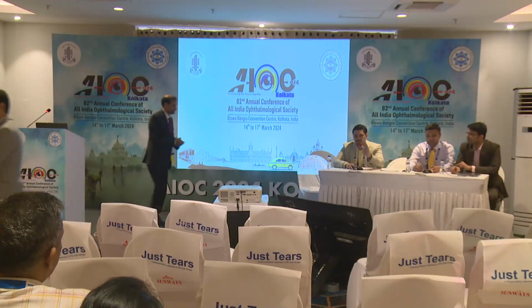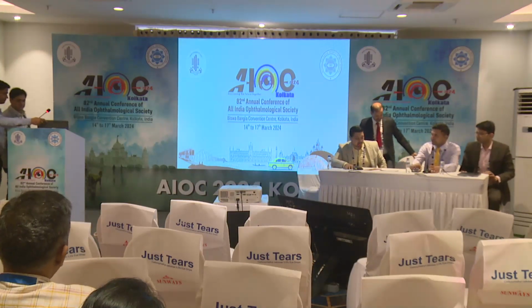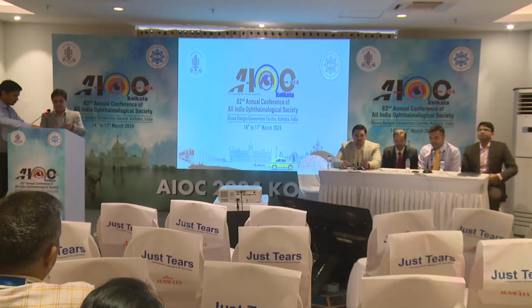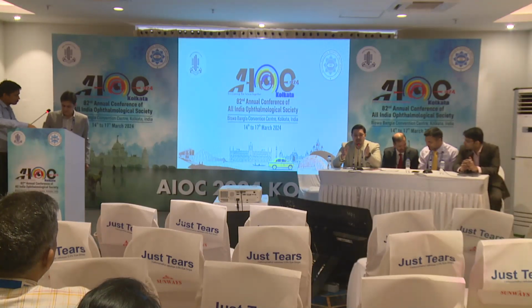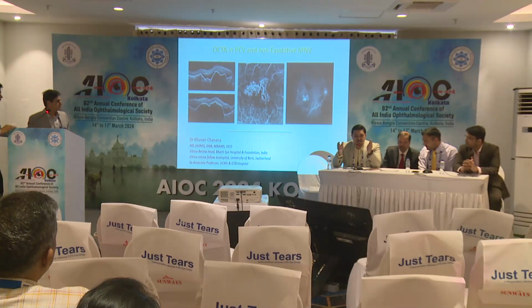So for the audience, I would like to share that when you understand the basic pathophysiology of diabetic retinopathy, it is the vessels that get obliterated. So when you do a foveal scan in these patients, you look at the decrease in the vessel density, meaning the number of vessels in that particular area. It tells you that the diabetic retinopathy is progressing. The FAZ size increases, the vessel density goes down, and this tells us that there is a progression of diabetic retinopathy. This is how OCT angio is useful in diabetic retinopathy, apart from what has been mentioned by sir and other experts.